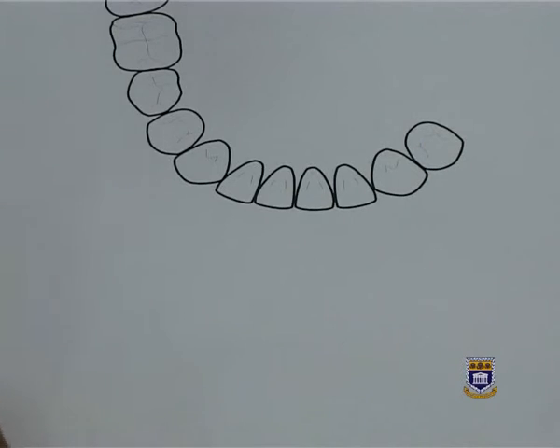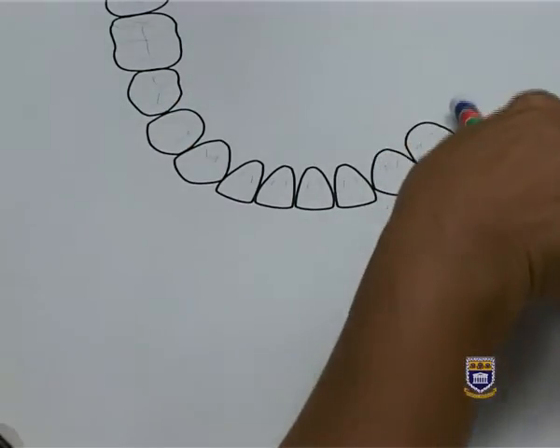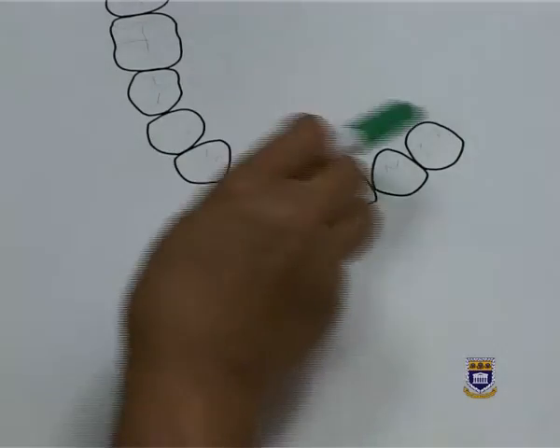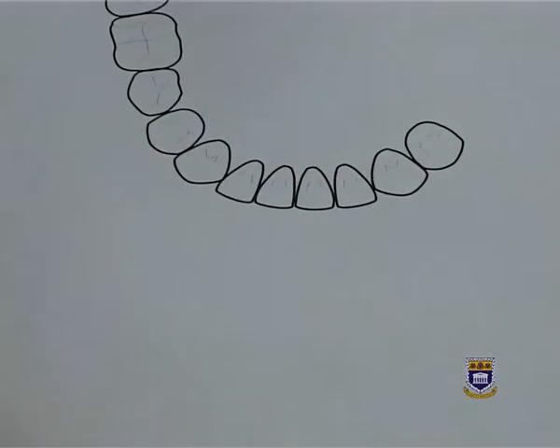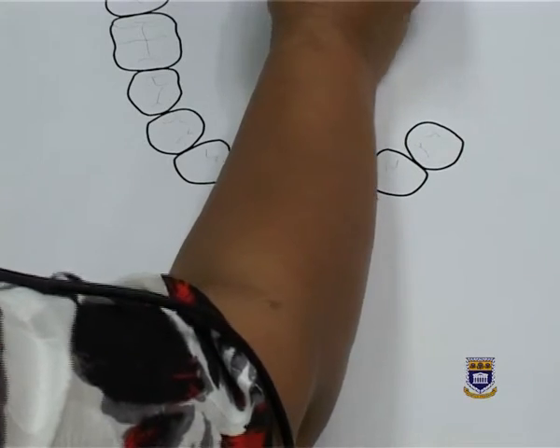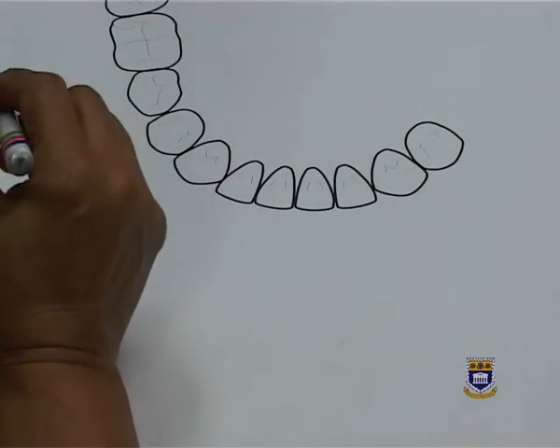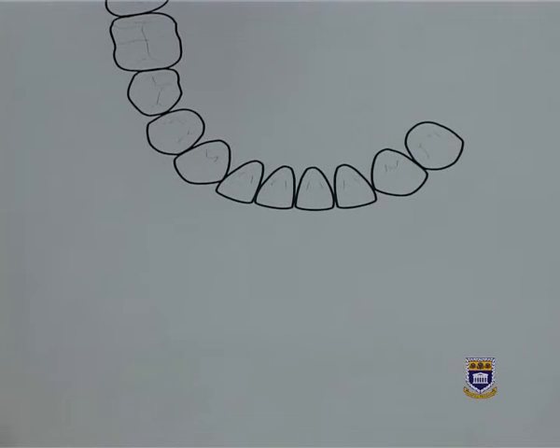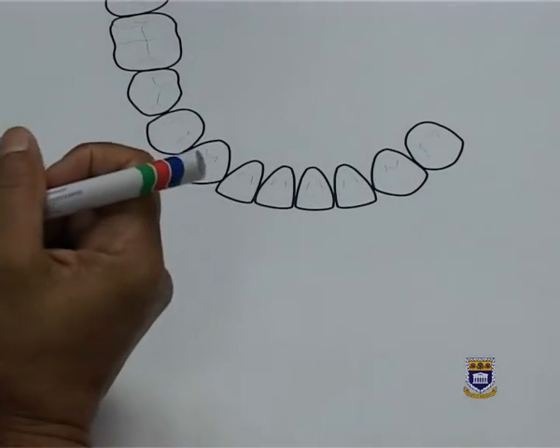For this one, this will be a class 2 partial denture, a unilateral edentulous saddle. The patient has a premolar abutment and molar abutments. And in this case again, this will be my metal partial denture, which is always a first choice in lower partial dentures. We will follow exactly the same steps again to ensure that all the components are there, that I've satisfied the principles of a partial denture.